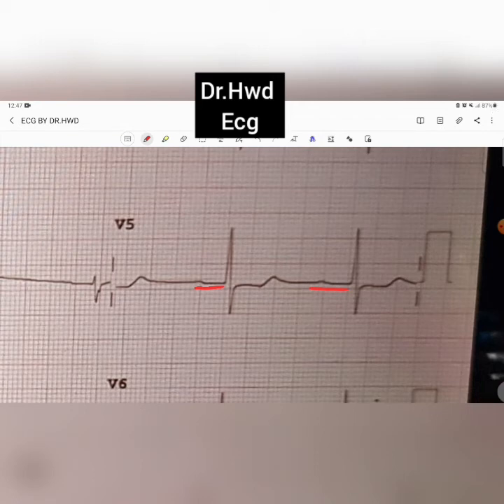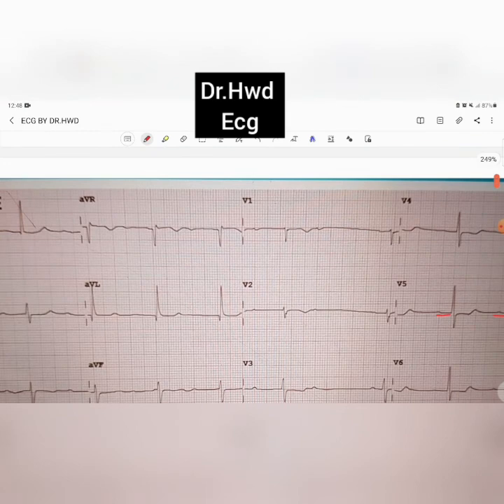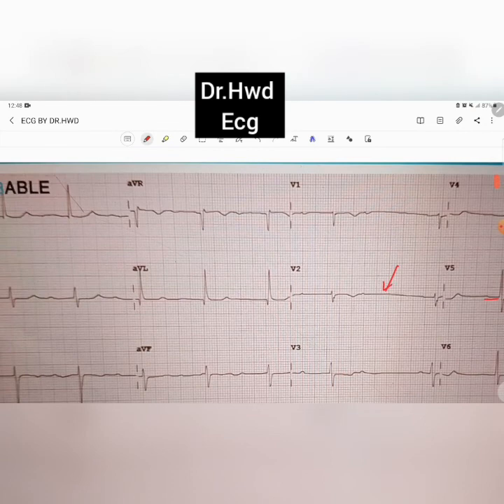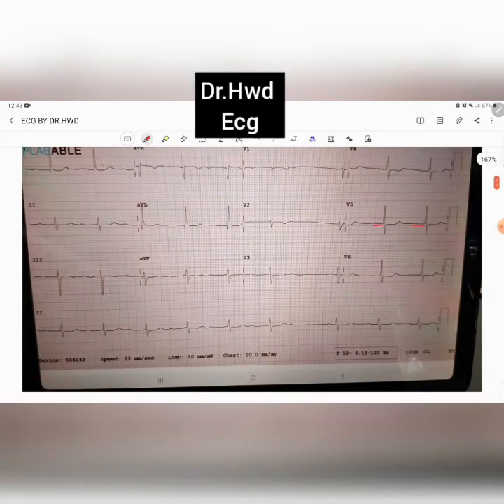It's your type 2, right? It's your type 2, Mobitz type 2. Okay, why do we say it's your Mobitz type 2? It would be determined over in this lead. Let's look at, I chose the wrong one, right? So here you see you don't have your QRS complex. You don't have your QRS complex. So this is your P wave, sorry, this is your P wave, this is your P wave, a dropped wave, right? So this is your Mobitz type 2 that the person keeps on coming on time and then there is a drop.